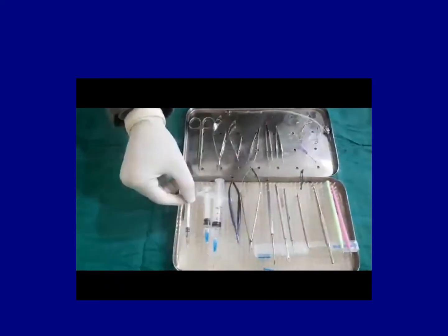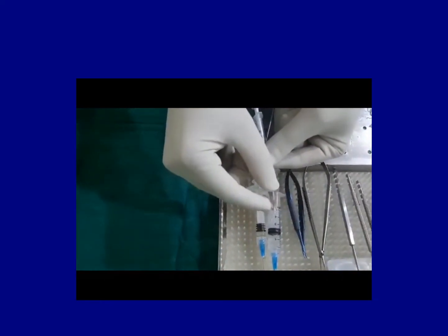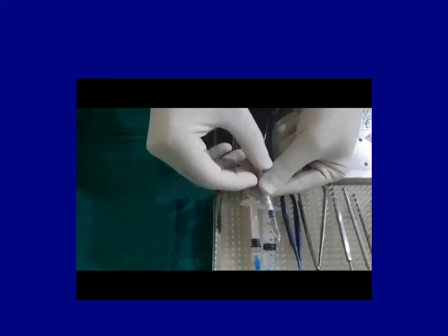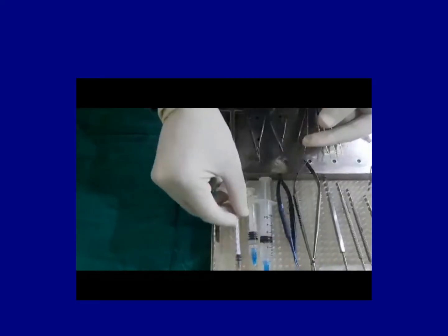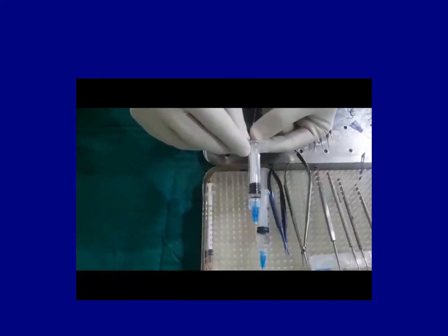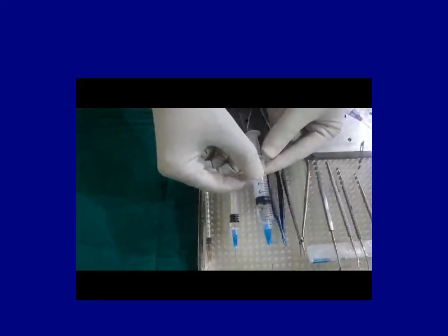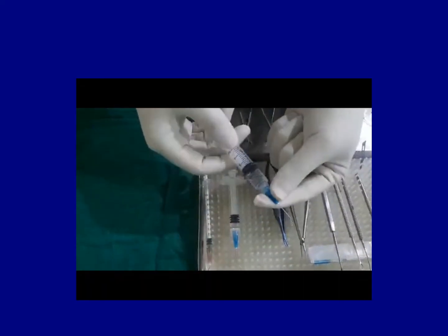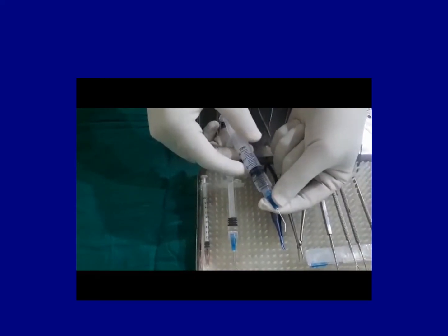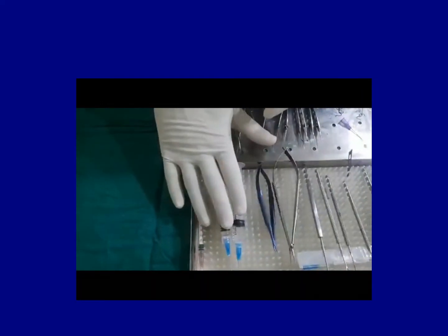First of all, syringes. This is a 1 cc syringe and it has a needle on it. The needle is bent to do the capsulotomy, or to make a hole in the anterior capsule for cataract surgery, which we call a cystotome. This is the viscoelastic. This is the one that we use to inflate the eye during the surgery so that the eye keeps formed. This is a normal 5 cc syringe which has a cannula on it, and that is used to do the hydrodissection or to wet the cornea during the surgery. So this is the first set of instruments that you see in the cataract set.